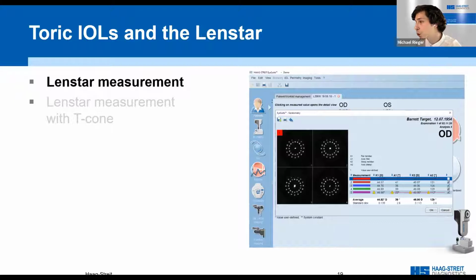Also here, once more, you see, like I have explained before, for example, there is one of these measurements that is crossed out because it is marked as being not a good measure, and this is the way how you can reduce the standard deviation for your overall measurement.